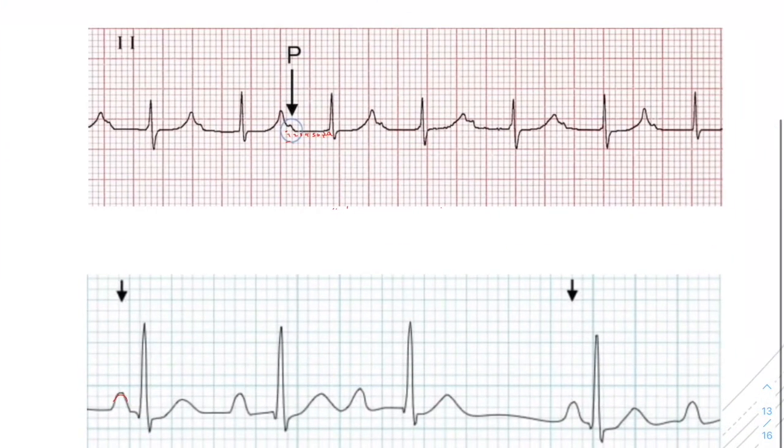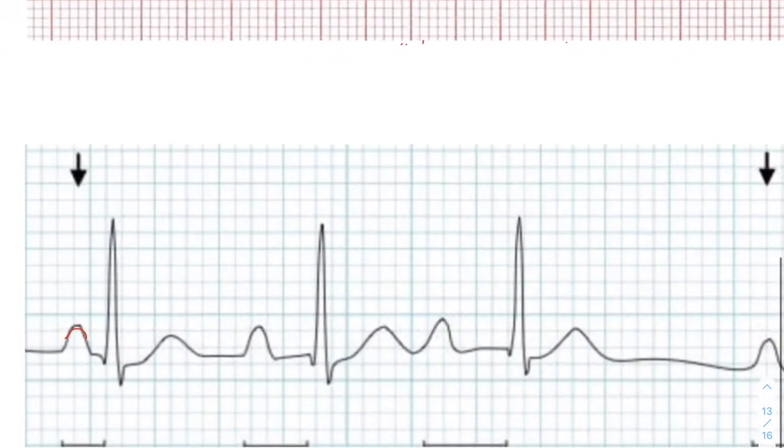And that's one example. Here's a second example, again, where you have the beginning of your P wave here, and then this is the beginning of the QRS. So this is kind of 1, 2, 3. Okay, that's 3, which is less than 5 small boxes. That's pretty good. The next one you have starting here and ending here. This is 1, 2, 3, 4, 5. So maybe a little bit less than 5 really. That's getting a little bit longer.